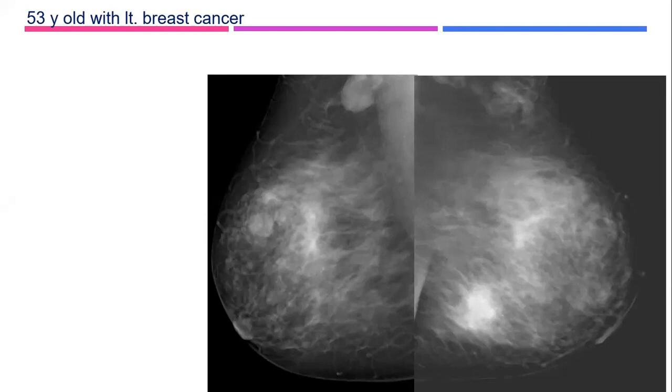And there is also, in the right breast, a posterior focal asymmetry. Where? On the left breast, posteriorly. Left or right? I mean right. Right. There is obliteration of the posterior fat. This is projection, same as here.